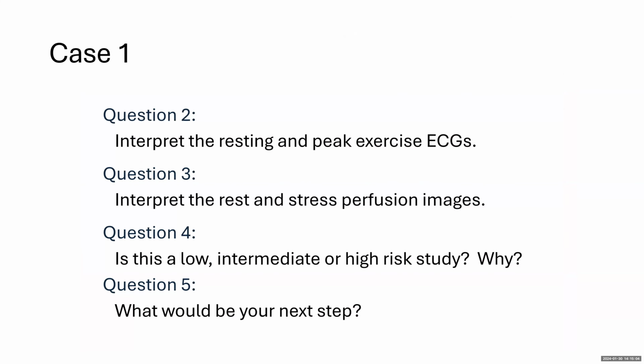So back to interpreting the rest and stress perfusion defect. Is this a low, intermediate, or high risk study?